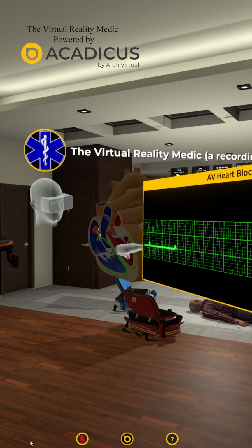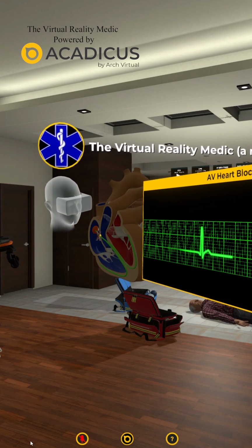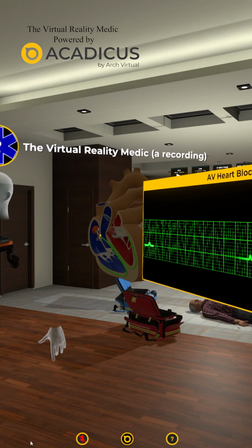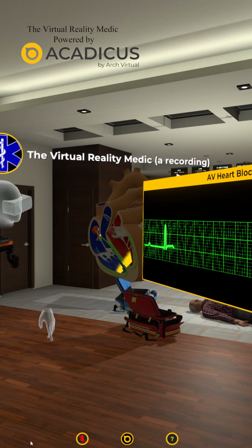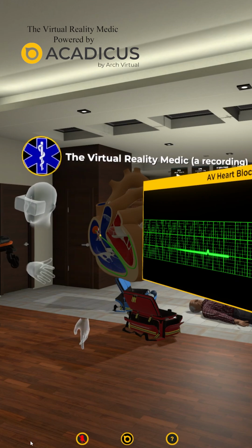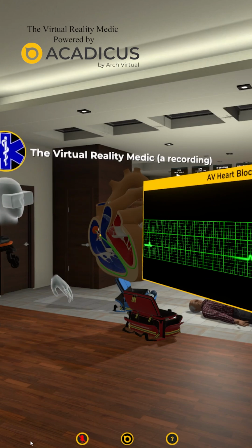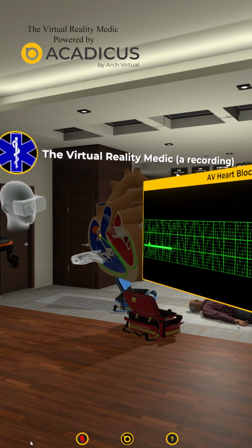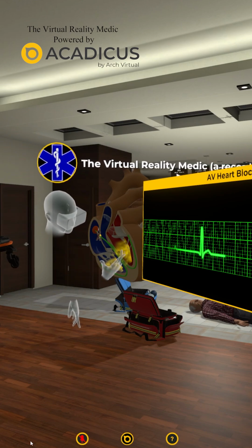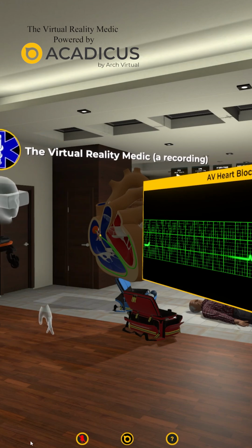There's a P wave, no QRS. P wave, no QRS, but the P waves are doing their own thing. They're coming at the right time. Look, there's a QRS complex. Now, some people say, well, that's a narrow complex, that doesn't happen in third degree. Oh, yes, it does. Yes, it absolutely does. And it can happen when that foci that's creating the ventricular beat is real high up here. So yeah, you see there's a narrow complex in this one. A lot of times it does look wide, and it looks wide because when the electrical signal comes from the ventricles, it looks wider on the ECG.